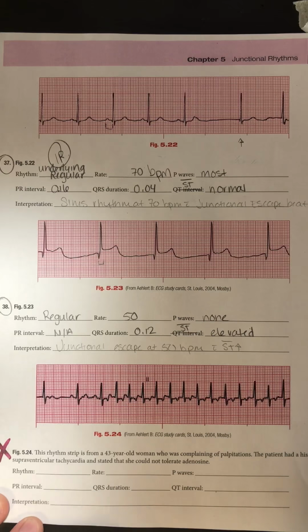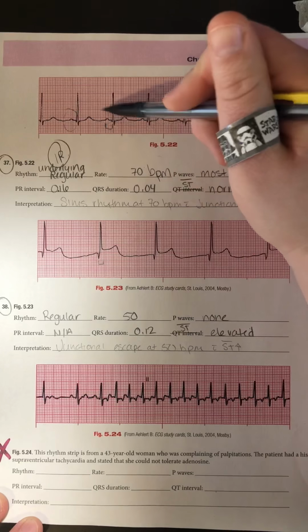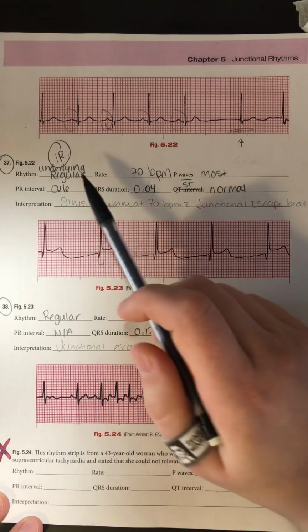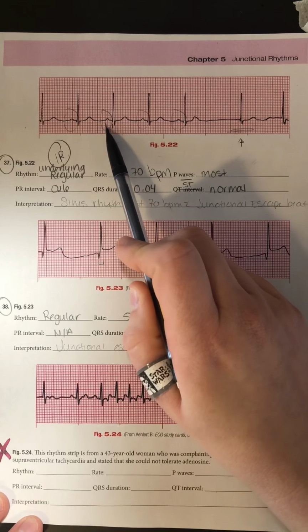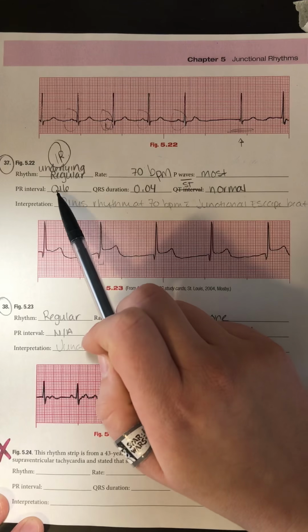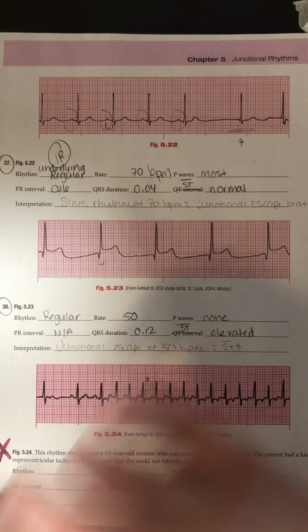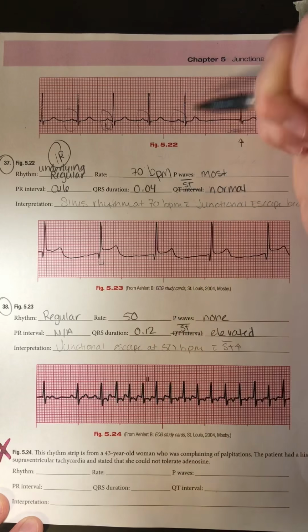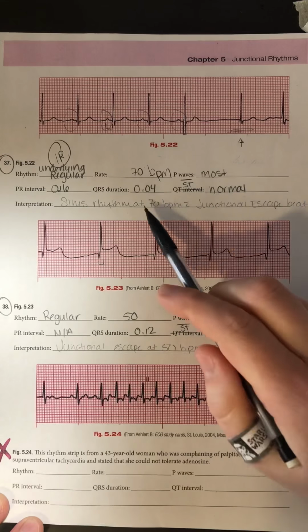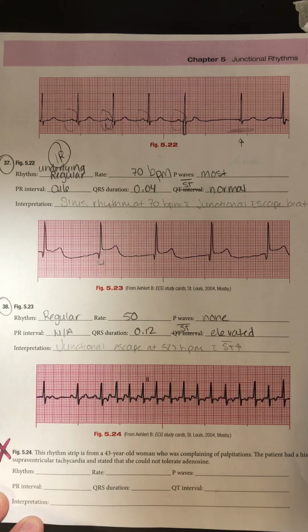For P waves, most of my complexes do have P waves. So you can see here, this complex, however, does not have a P wave. When I do have P waves, I measured my PR interval on my sinus beats, and I got 4 small blocks, which was 0.16 seconds. My QRS duration was only 1 block. You can see it very well here where the QRS starts and where it stops is 1 block, maybe 1.5. So it's well within normal limits. It's narrow. And my ST segment is normal.